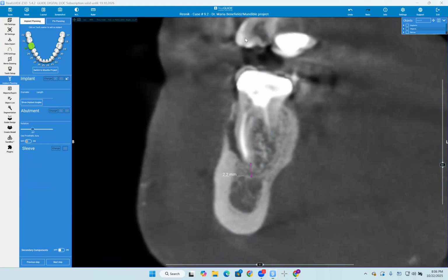And that is what I told her, but I thought, well, let me just present it and see what your thoughts are. So for everyone else on the call, we want 2 to 4 millimeters beyond the apex. However, as you see, Dr. Hussein put 2.2 there. That is to the actual nerve. We need 2 millimeters to the zone of safety. So we actually have 0, because by the time you'd extend it, you'd be right into the nerve. So you actually need at least 4 millimeters from the nerve to the apices to do an immediate. So this would not be a good one.